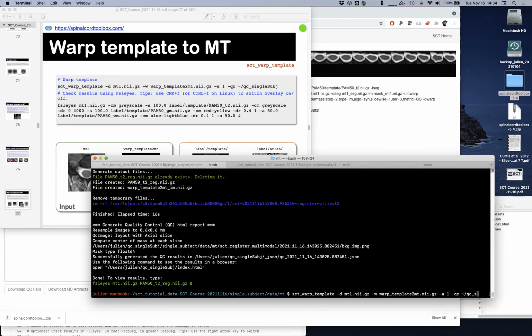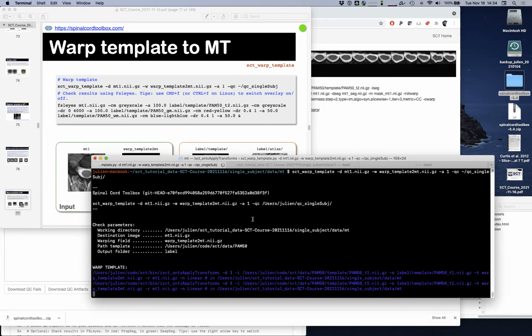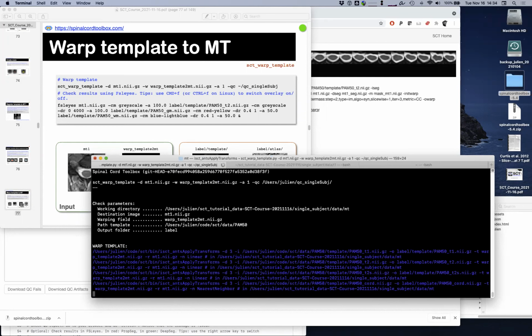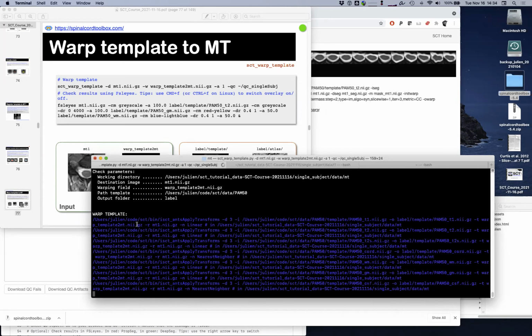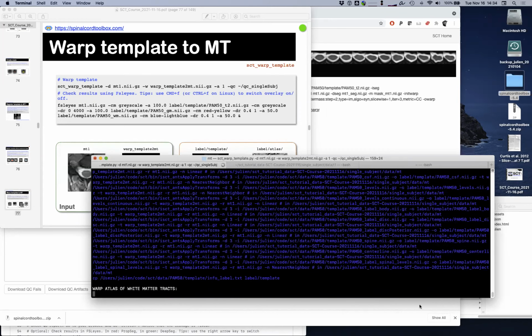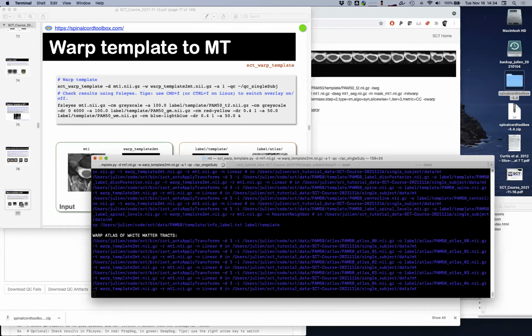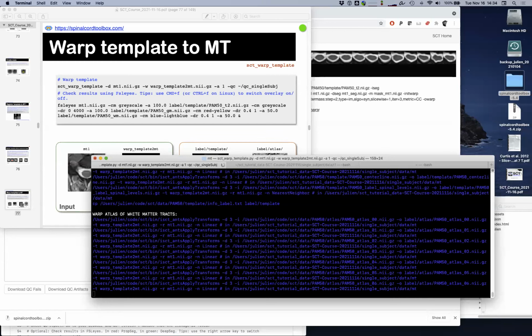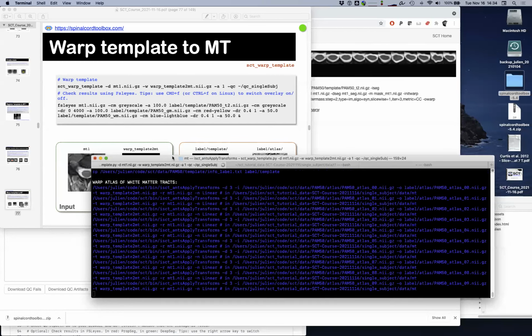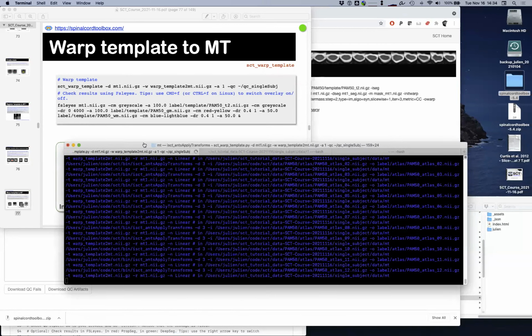QC single, here we go. That's going to take about a minute. Good time for questions. I lost the chat window from questions.